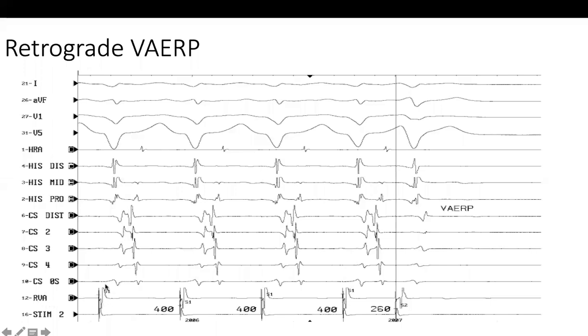The first activation was recorded in the RV apex electrogram. And yeah, S1, so we have S1, S1, S1, S1, and S2. Yes. So if we have this kind of order, S1, S1, S1, S2 in the ventricle, what are the things that we might be looking for?